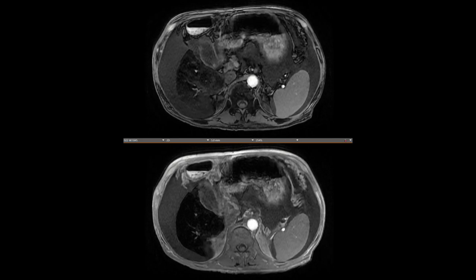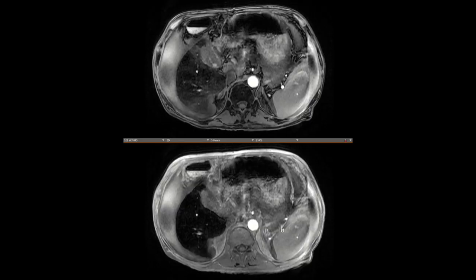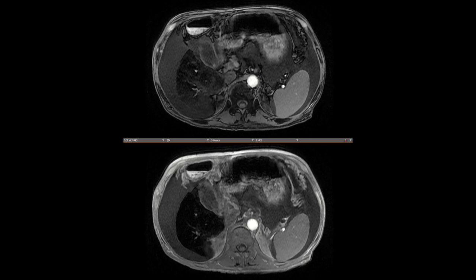And so this is a patient who actually has primary or hereditary hemochromatosis, which is caused by increased intestinal iron absorption. The increased iron deposits in parenchymal organs such as the liver, the pancreas, the heart, and the pituitary. And that's to be distinguished from secondary hemochromatosis, which is usually from taking a lot of iron or infusion of blood products, in which you typically see the liver and the spleen having decreased signal on the in-phase image.